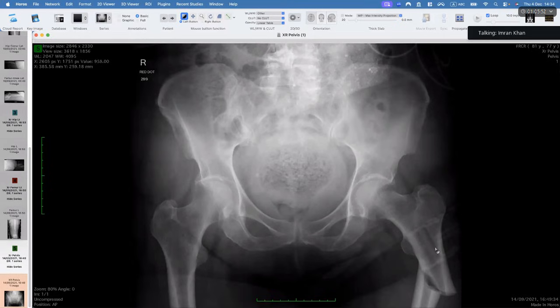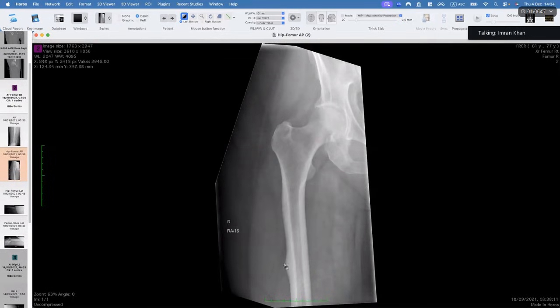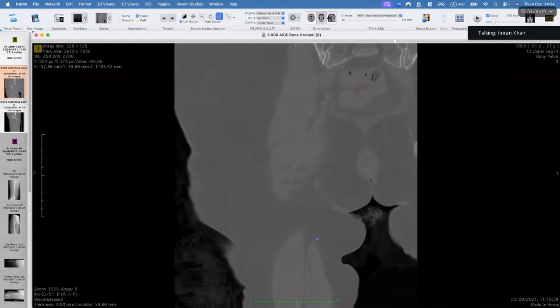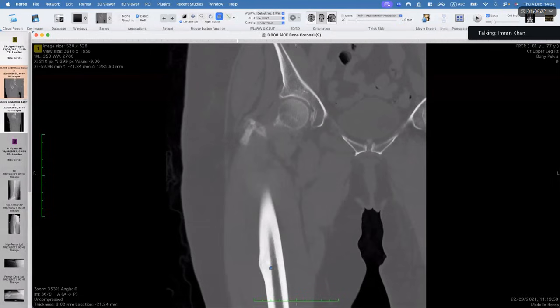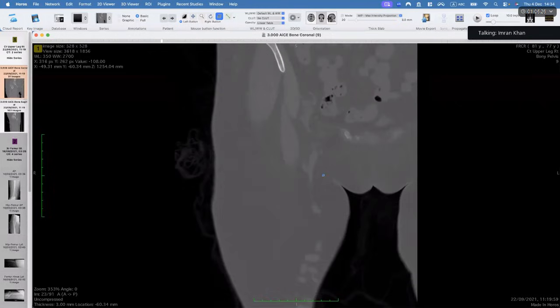The bone density looks pretty normal because they're on bisphosphonate, but it is an insufficiency fracture in reality, right? So this is a bisphosphonate fracture. And the clue, even if you were not sure about that, was in this radiograph, okay? There is periosteal thickening, and there's periosteal thickening at almost the same level as the contralateral side, because this patient has got an insufficiency fracture, which I can show you here. If you had done that, I would have shown you the CT scan, which would have shown you the fracture, okay? So this is a bisphosphonate insufficiency fracture.